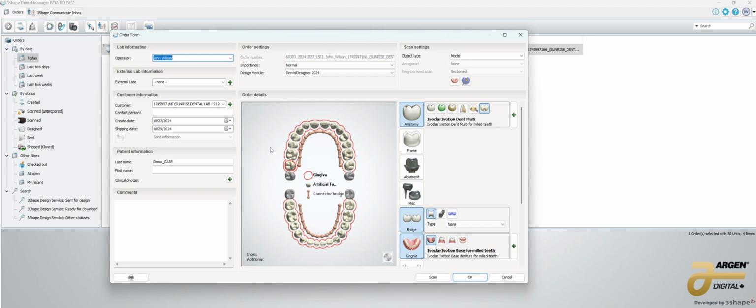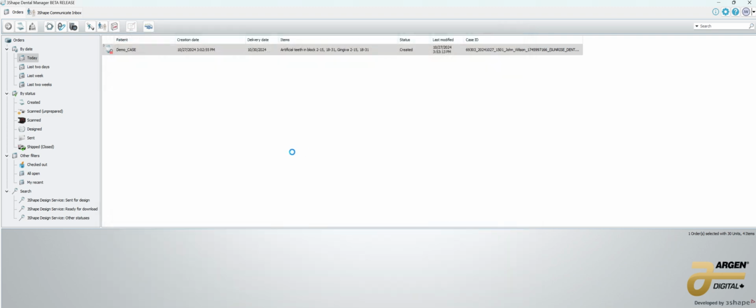So you can see it rather quickly here. It's going to be set up for a lab scan case. But you can very easily use a digital scan as well in importing this as a digital impression. Let's go ahead and do this. I'm going to go ahead and import the scans here, and we'll get rolling really quickly.